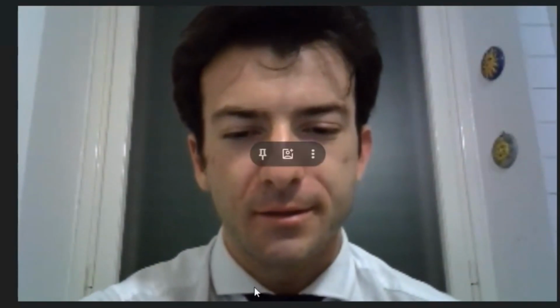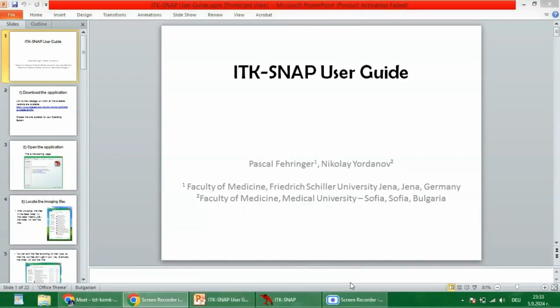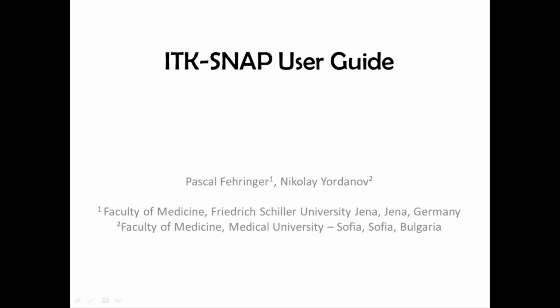Hello everybody, it's a pleasure for me to be giving this talk about how to use the software ITK-SNAP for segmentation of brain MRI scans. So let's get started. This is the guide we prepared and we will share the link to it so that you can access it whenever you want.